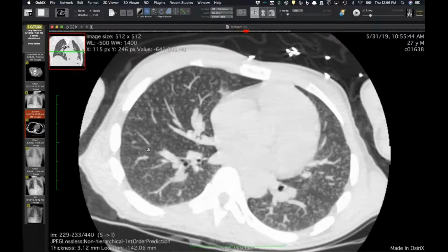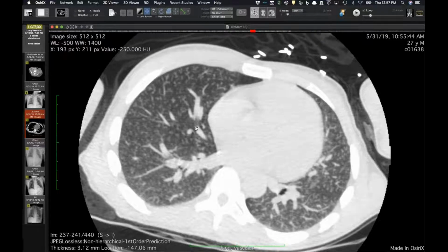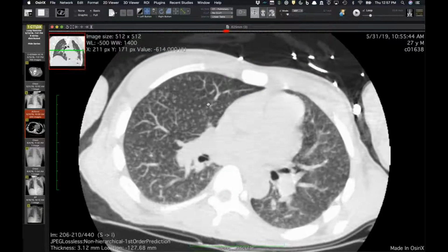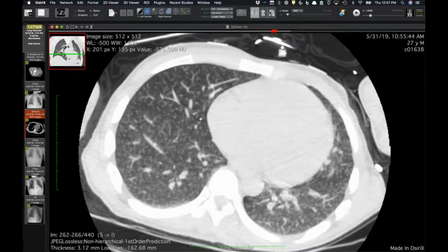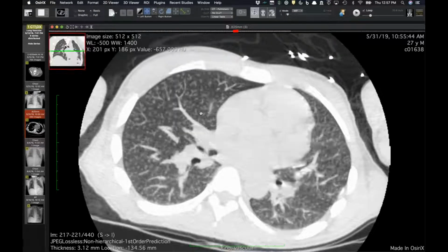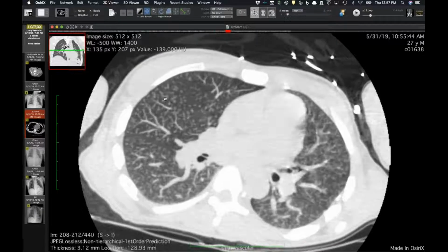And again, infection. Sorry, say that, David. They're just beautifully centrilobular. They just float away from the external pleural surface. And like we've made the point many times, whenever you see stuff that's this diffuse, unless it's actually miliary, but when it's this diffuse centrilobular, it's not infection in most cases. It's like some sort of either exposure through the airways, like a hypersensitivity pneumonitis, or it's something being injected.